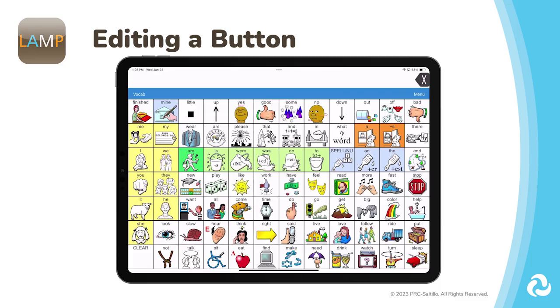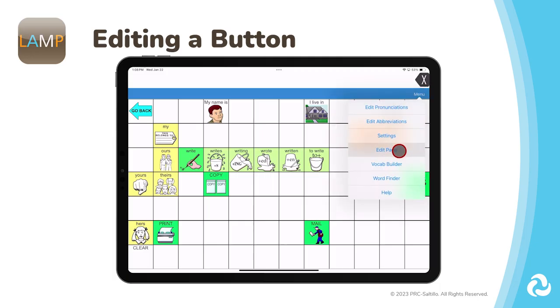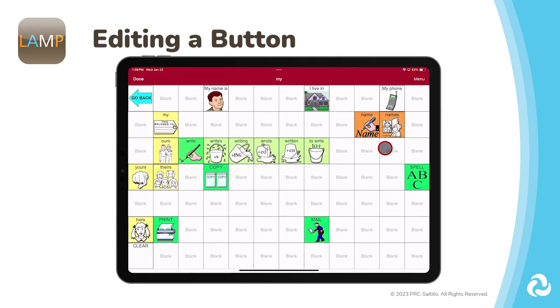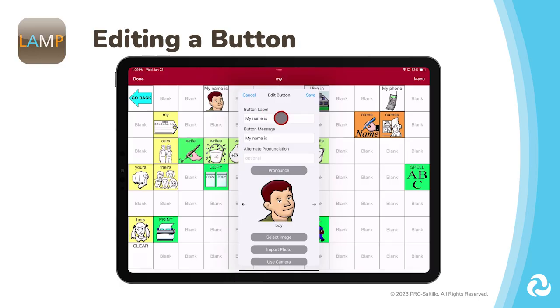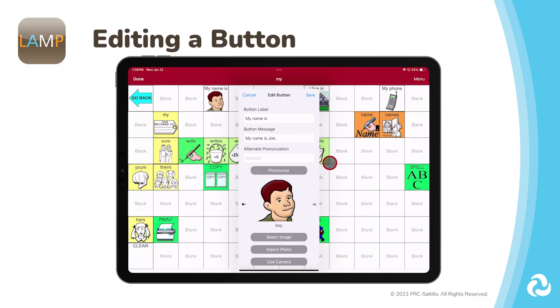You can add the AAC user's name by going to My, and there is a button for My Name Is. Tap on Menu, then Edit Page. The red ribbon across the top lets you know that you are in edit mode. Select the button you want to edit, then edit this button. The button label is what you will see on the button. The button message is what the button will say when pressed. Place the cursor in the text box and complete the sentence by adding the AAC user's name.